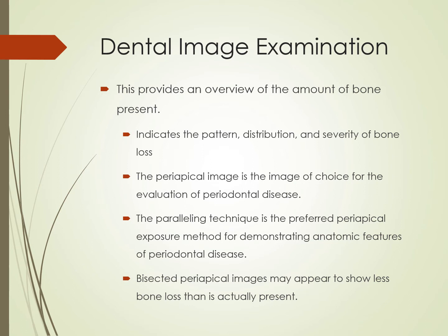Okay, so while our bite wings are one of the best indicators as far as having the best angulation and showing us some of that beginning stages of bone loss, when it comes to 100% accurately recording the bone levels on our patient overall, we need to not only look at how much bone they've lost, but how much bone they have remaining, which forces us to look at our PAs.